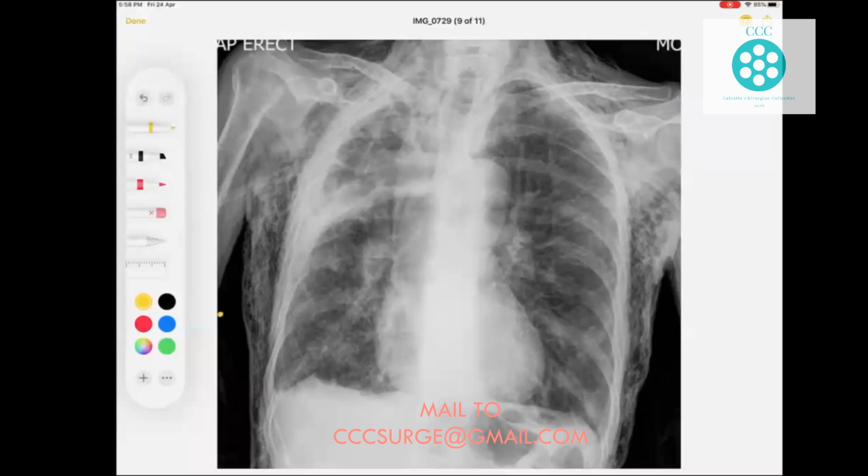Okay, the A stands for the trachea. That means A is okay. The lung shadows, I do not know, because there appears to be something down here. So on the right side, A is not okay. There appears to be some problem of consolidation or some shadows in the A. Now, the B part is bones, and we can very simply see, wow, if you have picked it up, congratulations. If you have not, can you kindly see that this clavicle is broken? So the clavicle is broken down here. Wow, they really did not look into that.